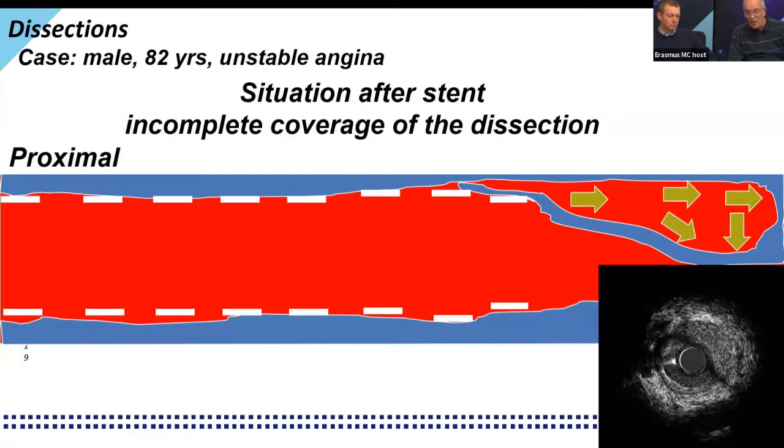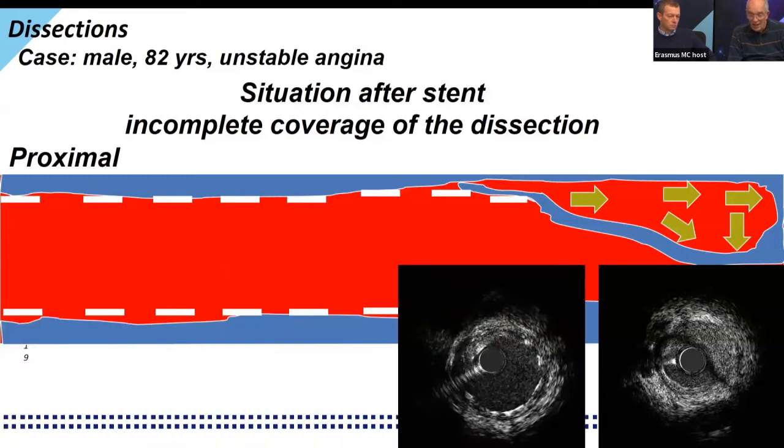These are the pictures that I mentioned. You see in the picture from 12 till 1 non-moving blood trapped behind the medial layer. So it's between the media and the adventitia. The blood can't go anywhere, so you get spontaneous contrast in there, as non-moving blood. And this is the edge of the stent, and probably it's not that clear. It closes here at the edge, the opening of the dissection.